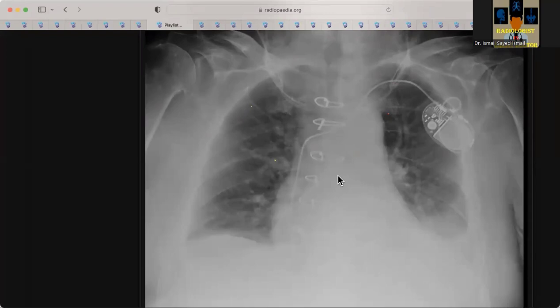I'd also like to check the other lung fields for any additional opacities, and check the bones for any associated bony abnormalities. No pneumothorax or pneumomediastinum. So summary-wise, what would you do?